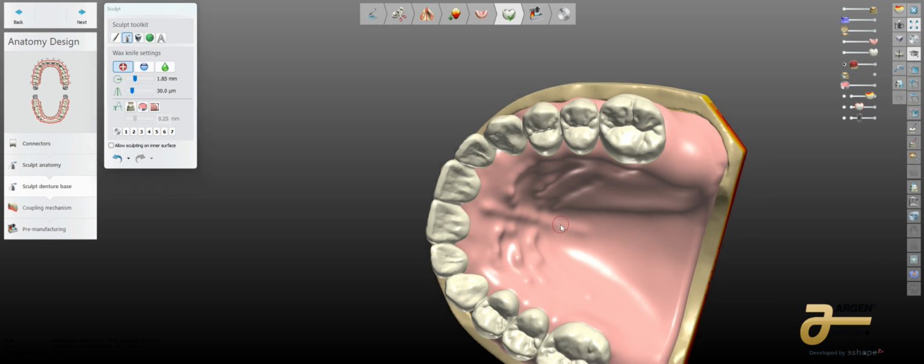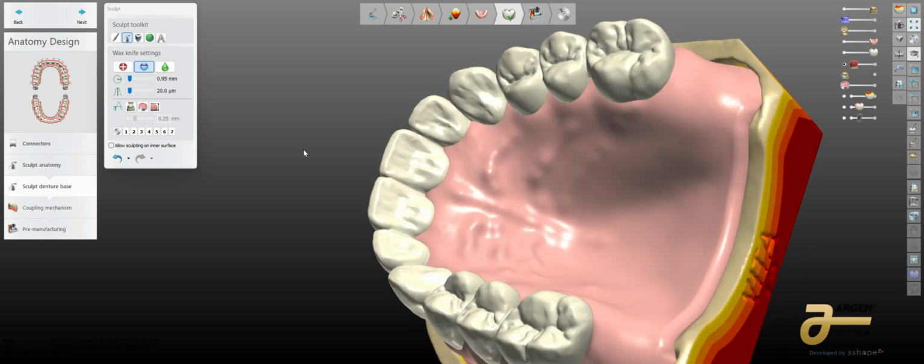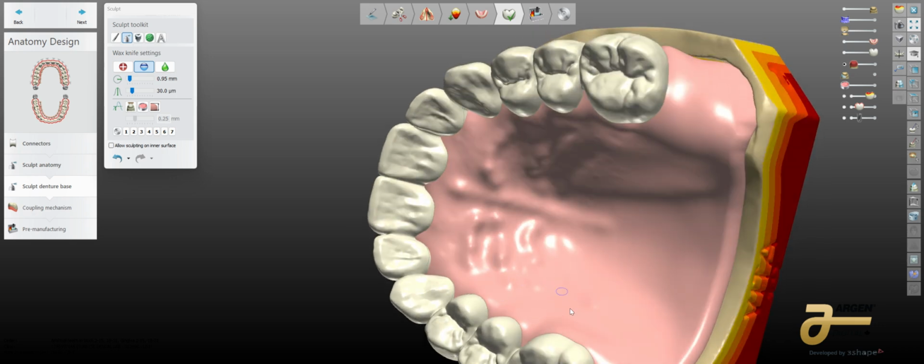Now I'm going to put the power down. I'm going to go here and turn it to the reduce, and I'm going to just make some texture. Add a little power. Little more power. And again, all of this little stuff is something you can refine on your own as much time as you want to spend on it.